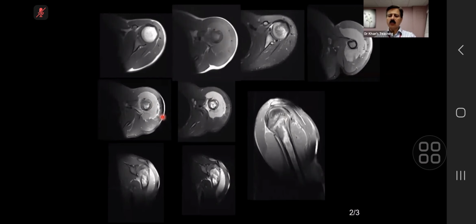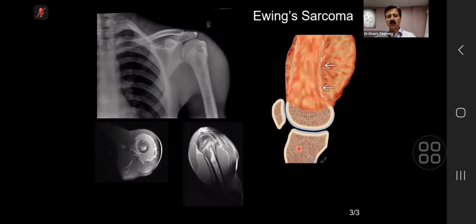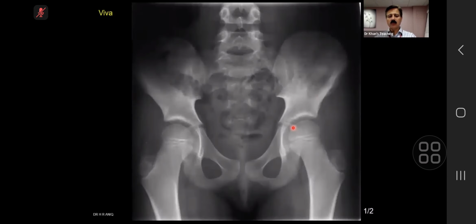Lymphoma can also cause a soft tissue like this, but usually not as thickened. Number 2, lymphomas in this age group with this kind of radiology are much rarer. Out of 100 cases, maybe 5 of them might be lymphomas. But radiologically speaking, yes, lymphoma can be kept in the differential with this fine print that the soft tissue might not be as much. So this is classical Ewing sarcoma, and this picture also tells you what happens.